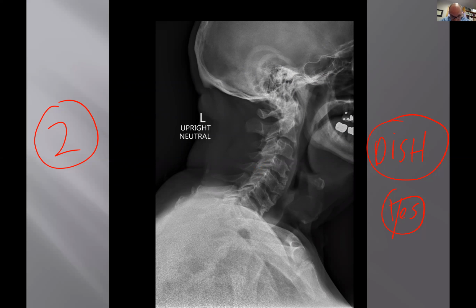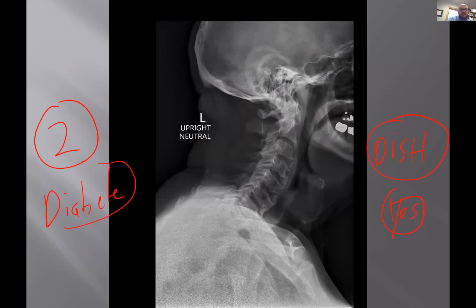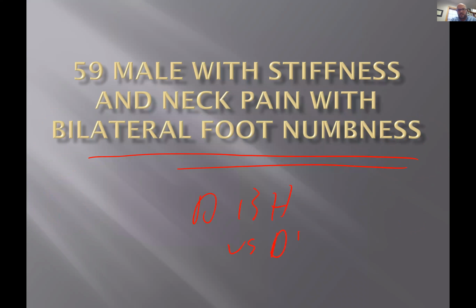So stenosis from OPLL is kind of ruled out here. But guess what? It was undiagnosed. The patient had diabetes, and it wasn't being treated very well, and they were getting peripheral neuropathy, which was creating the leg symptoms. So diabetes is a very important complication, and in this case, it was super helpful to distinguish DISH versus degenerative disc disease. It's important. This stuff is important.